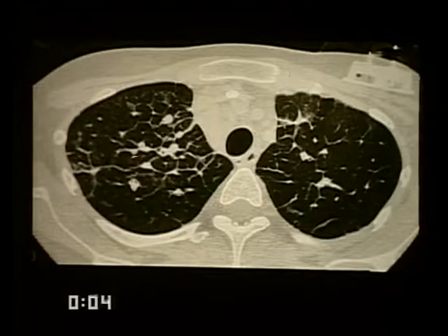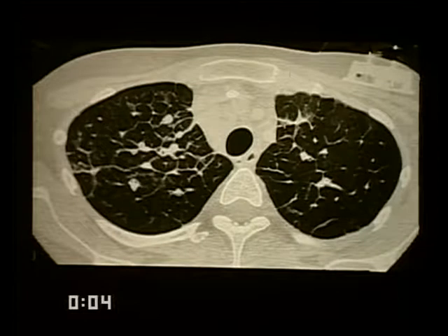There is also an alveolar wall interstitium, which is very rarely visible with any of our technology. On the high-resolution scan, in certain diseases, the exact same anatomy can be very, very clearly seen. Here is the secondary pulmonary lobule schematically demonstrated, and if one looks closely here, one can see another secondary pulmonary lobule.